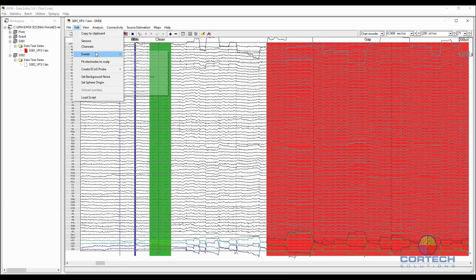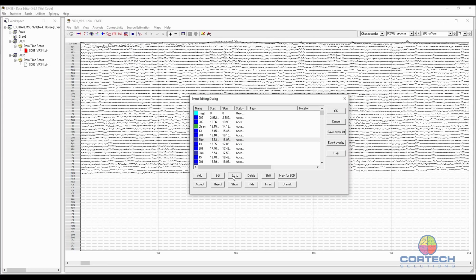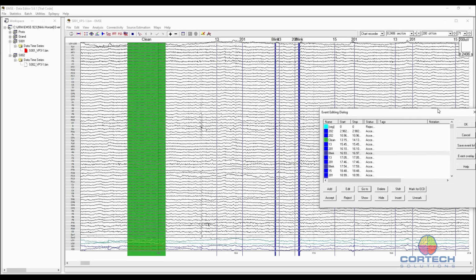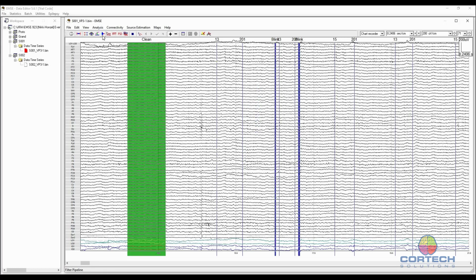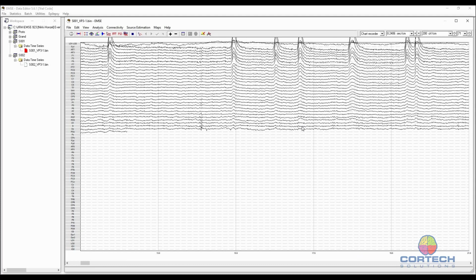Let's go through the data and look at some others here. There's a blink. These are the ones that were marked. Of course, not all blinks were marked, and of course we want the blinks that weren't marked to be also corrected. So let me cancel this. Let's just see if there are other unmarked blinks in this window. So I'll uncheck this. So this one is not grayed out, so it's live, and we can uncheck it. Ah, yes, indeed.